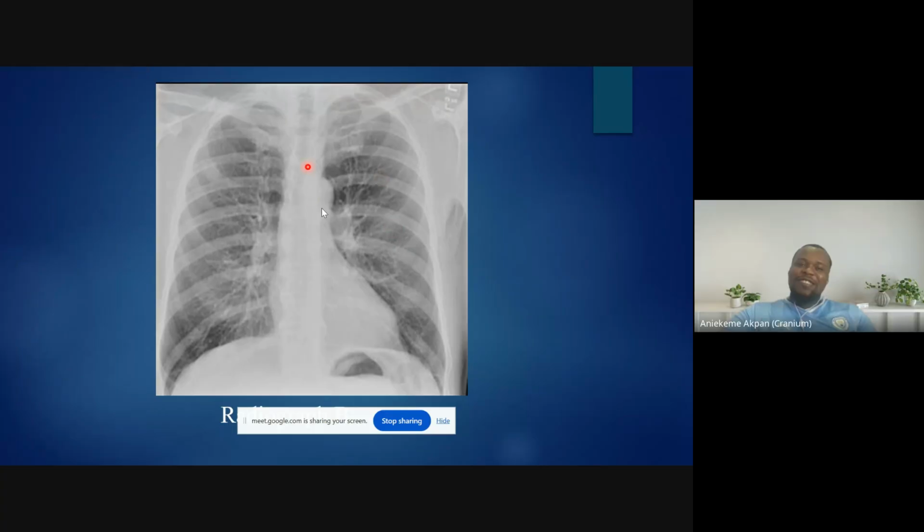for the purpose of demonstration. When we are talking about adequacy, yesterday they taught you how to assess image quality, looking at the rotation and all that. But now we are looking at the lungs itself, and the image has captured the lungs we are looking at. So, is there anybody that wants to try this particular pattern?